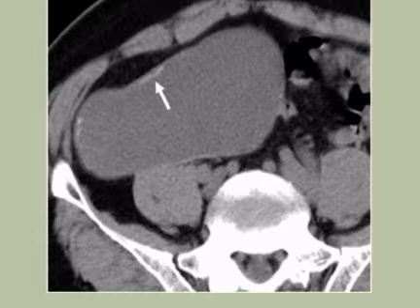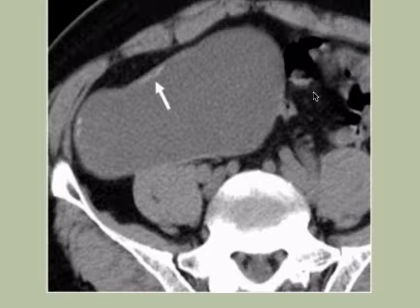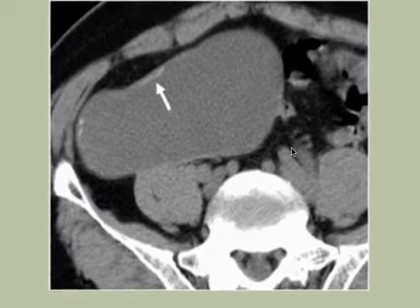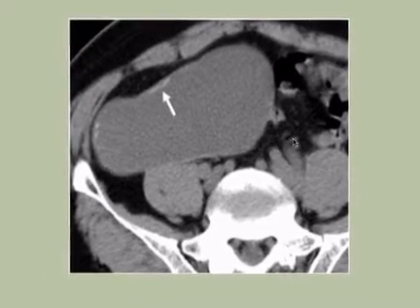Here we have a large mucocele, and one notes that the calcification is somewhat elevated in the wall, making one worry that there may be some level of low-grade malignancy in this wall. This mucocele, on its radiological appearances, really would need to come out and be histologically sectioned.